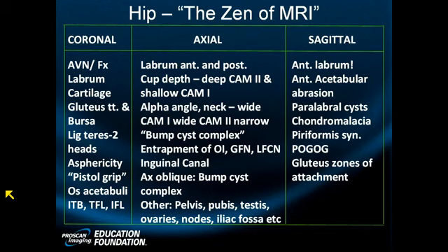So I'm going to redraw the line. And I'm going to draw a second line, I'd say right about there. And now I have my angle, which is 35 degrees. What should the angle be? Less than 55 degrees. So this is a normal, tapered femoral head-neck junction. If it wasn't tapered, if there was a big bump here, or if it was puffy, we'd say there's asphericity. But there isn't. That's not his problem. Let's keep going, shall we?